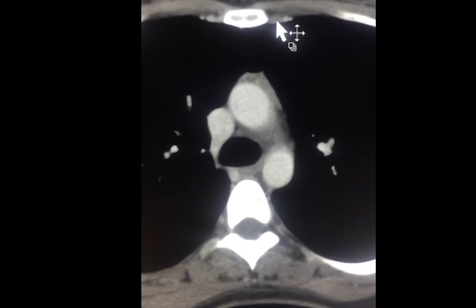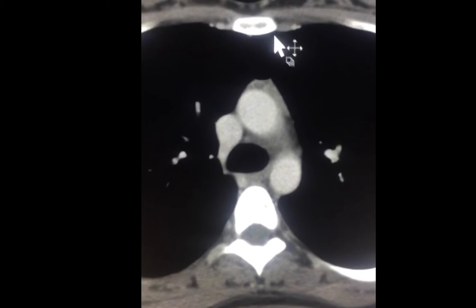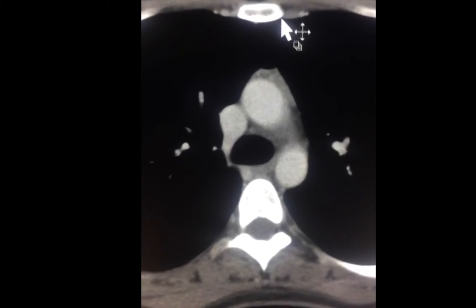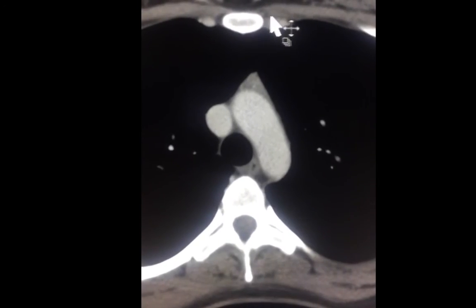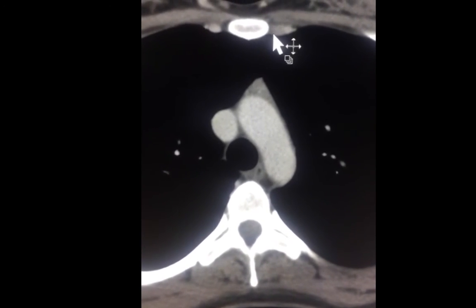Detecting internal mammary lymphadenopathy is difficult but is important, since if this is mentioned in the report, it changes the management. Once these lymph nodes are known, internal mammary area radiation may be performed. If this lymph node is missed, this could be the region of recurrence.